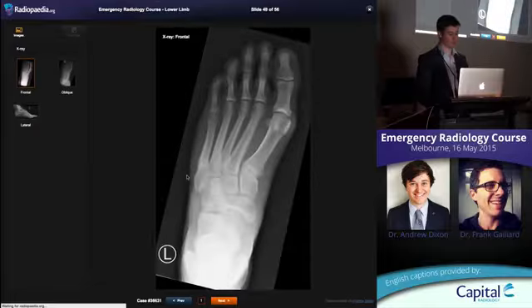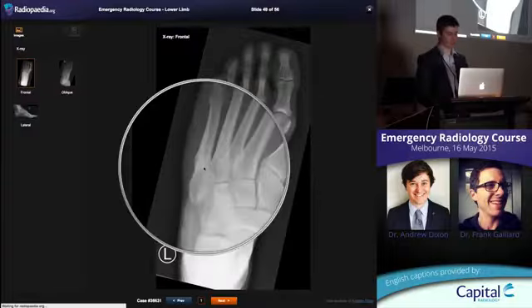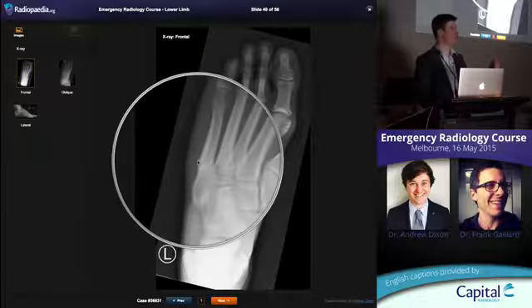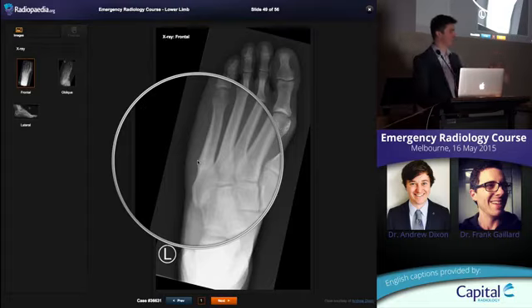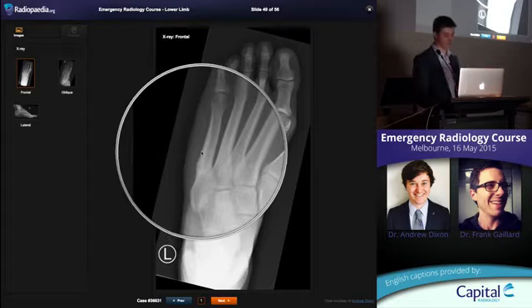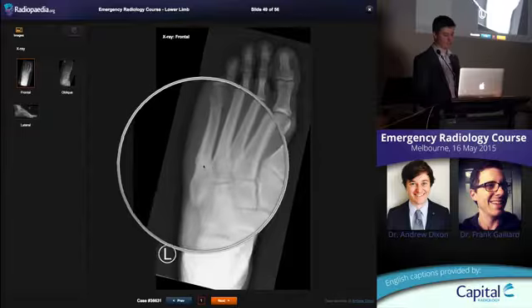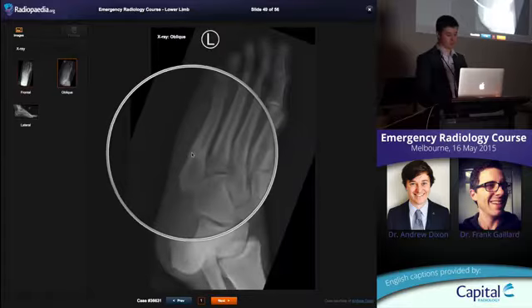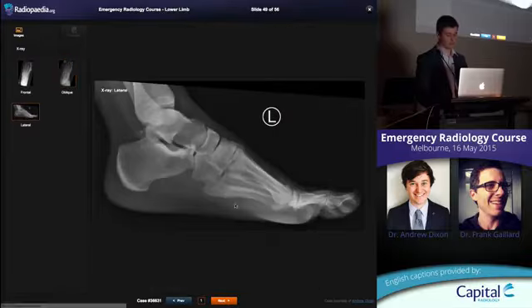The third one is the stress fracture, slightly further along the shaft. See how the cortex becomes thickened? Remember back to our woman who had the bisphosphonates, had a stress fracture. You could see the cortical thickening, the chronic remodelling of the periosteum there. Same thing here, it starts to bulge out, then you've got a fracture through the bone there. You'll see it on the oblique and on the lateral as well.